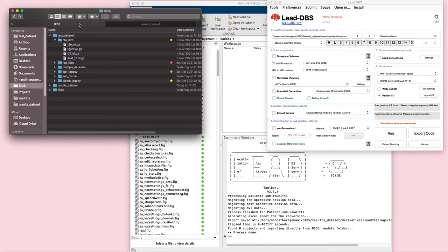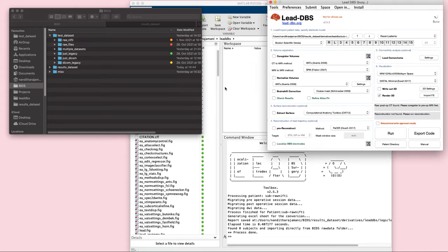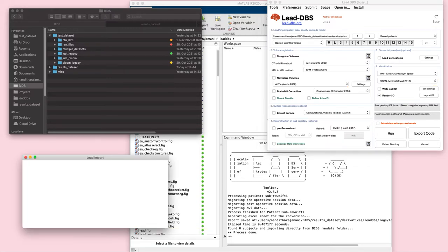So now that we've worked on the raw NIfTI files, let's look at how you can import raw files along with DICOM files in them. We follow the same steps as we had initially. We drag your old data set into Lead-DBS. It will open a dialog box which says that a DICOM folder is found, and it will run DICOM to NIfTI conversion.